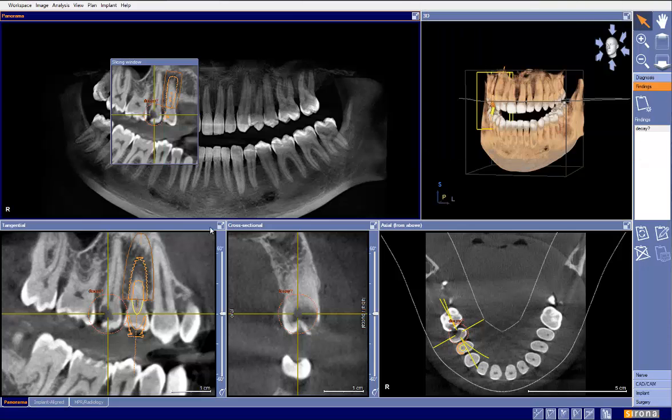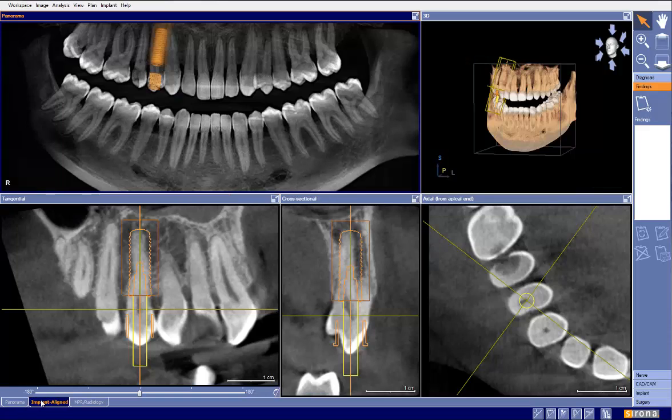And what this will do is it'll ensure that I know that you recognize that, or if you were sending this to somebody else, that that area was recognized. And again, I'm certain that it was, but we just want to make sure that that is put in there. So I'm going to go ahead and remove that finding and go ahead and focus on our implant.